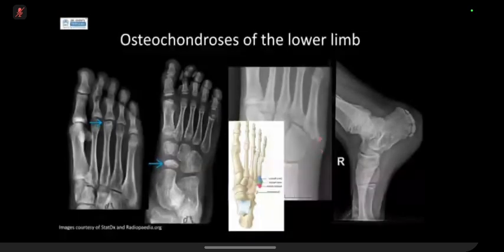So this one's a hard one. Things to look out for are whether you've got soft tissue swelling and whether the patient is asymptomatic, because this could also be a normal apophysis site. Don't confuse that. Apophyses are always vertical, fractures are transverse, lucencies are transverse, and you've got stress fracture, Jones fracture, avulsion fractures, but essentially if there's a fracture there, you call it a transverse lucency.